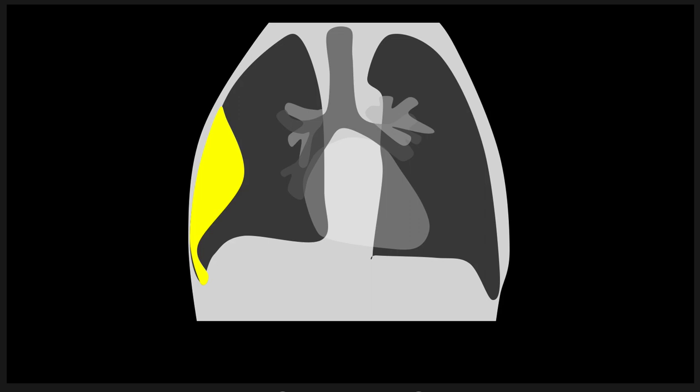Because a normal, simple effusion, like water, won't stick like that if the patient is upright. How might you prove that? Like if you weren't sure? I want to introduce a new way to take an X-ray here, a new positioning technique, and I'll show you how you could prove it, the simplest way to do it.